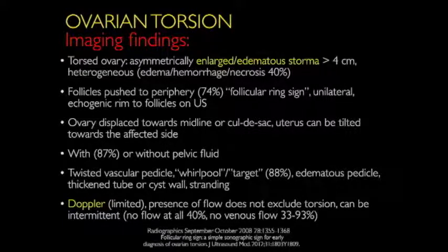There's often free fluid. And one of the very useful signs, which in the past we didn't really feel like we could see that well on the ultrasound, but I have to say that about 80 to 90% of the time nowadays we see the twisted vascular pedicle sign. In the older literature it was described as better seen on cross-sectional imaging, but perhaps it's one of those things that one of my great mentors said, that you only diagnose what you know or what you're looking for.